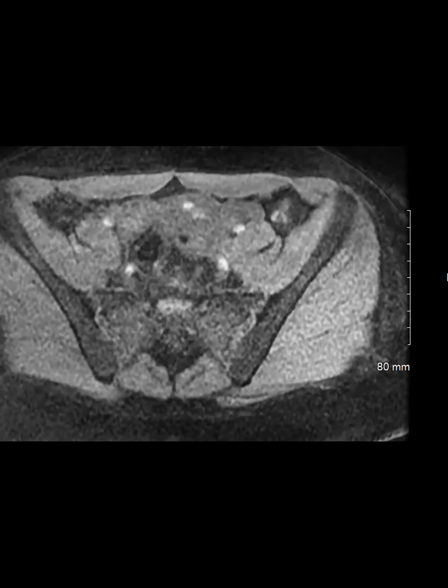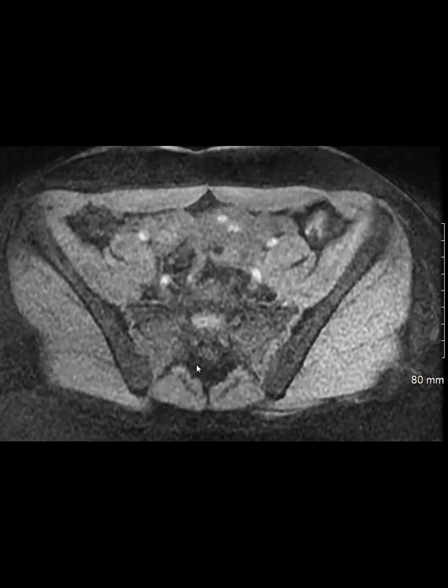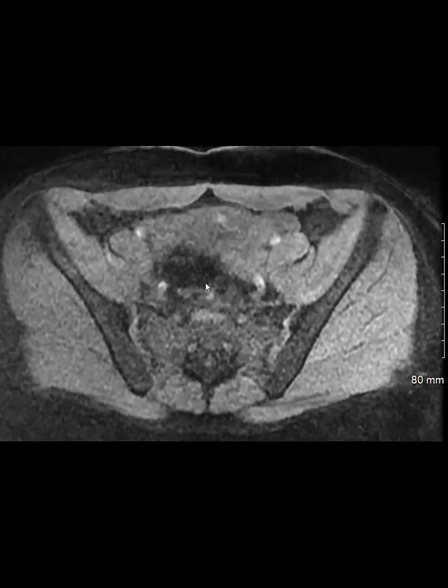My question is, they were not able to see it on the pelvic ultrasound, you said? No, they saw it on the pelvic ultrasound, but they thought it was an intrauterine gestation. And I was looking through to see how they could have mistaken it to be an intrauterine. Apparently, this can be confused on transvaginal ultrasound as well. It can be confused for an intrauterine gestation. Experienced eyes will be able to distinguish the two, but they can be mistaken for an intrauterine gestation.